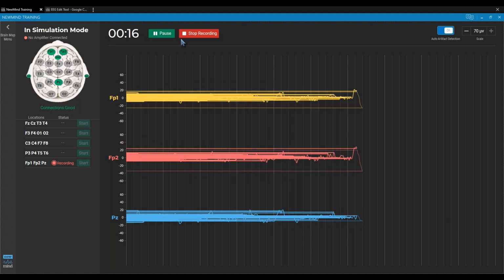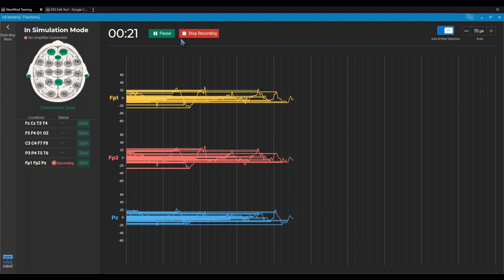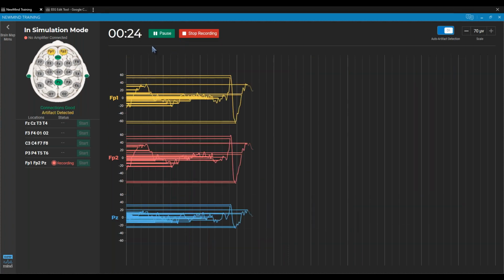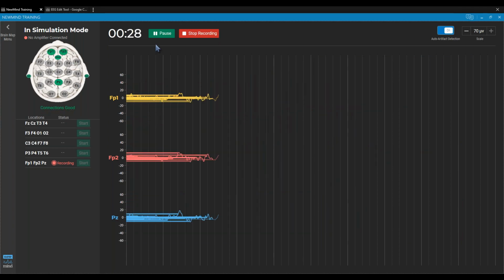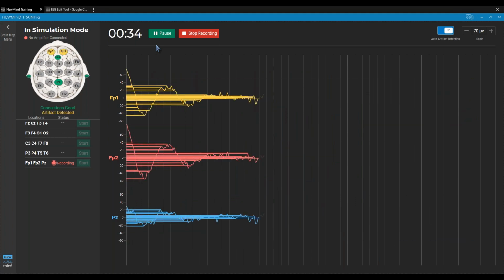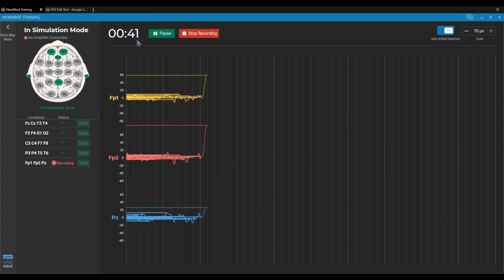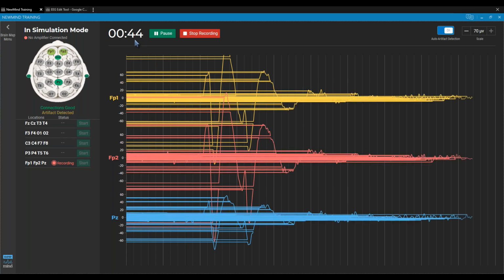If I'm getting close to a minute and the timer hasn't started, the software posts another message saying the baseline's taking longer than expected. Then I know, if the timer hasn't started within a minute, if I leave the auto artifact detection on, I'm going to be here forever.